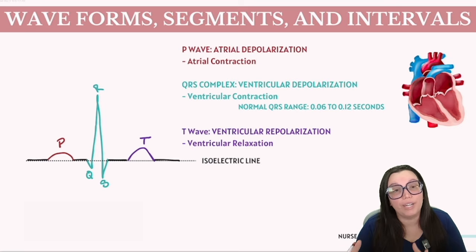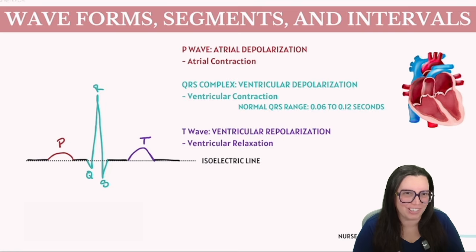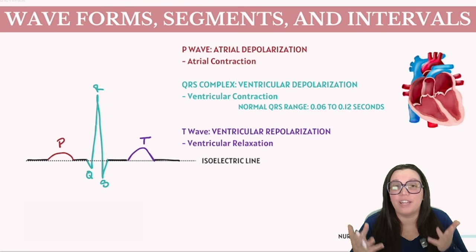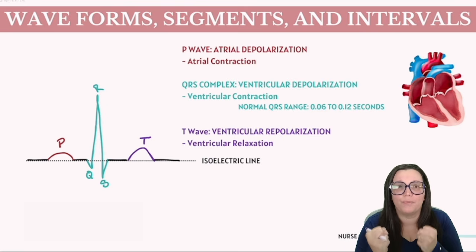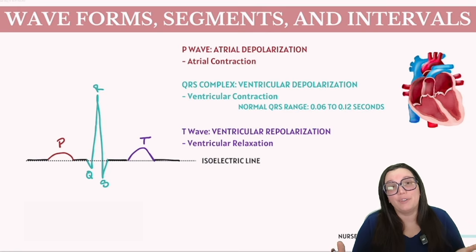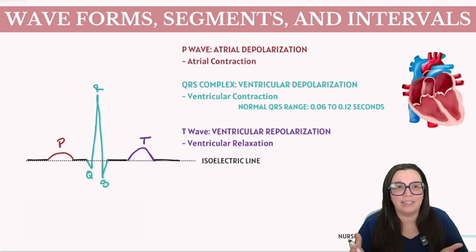Indeed, atrial repolarization happens concurrently within the time frame of the QRS complex. The QRS complex, being a pronounced structure, overshadows atrial repolarization. And this is because the ventricles contract with much more force than we see with the atria, effectively concealing that atrial repolarization signal. Therefore, atrial repolarization leading to the atria's relaxation occurs following the P wave but is encompassed inside the span of our QRS complex.